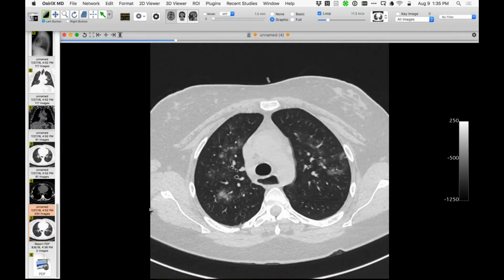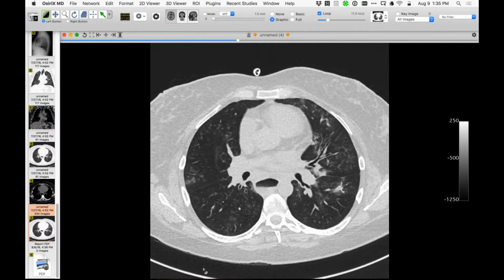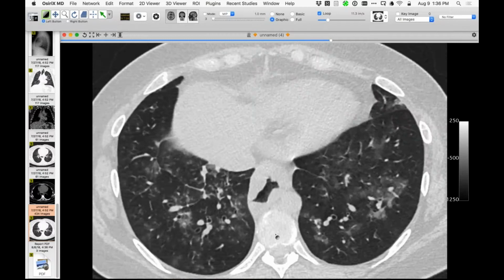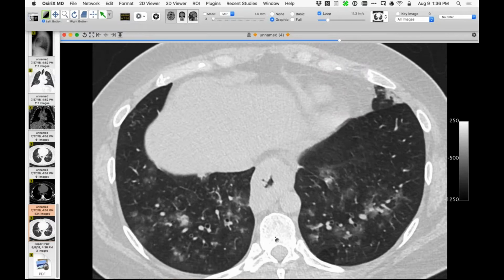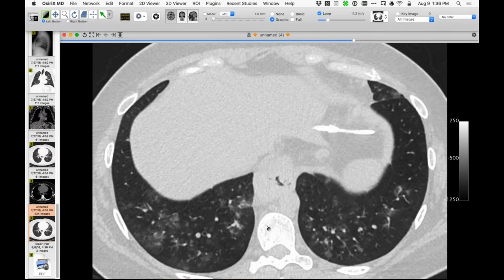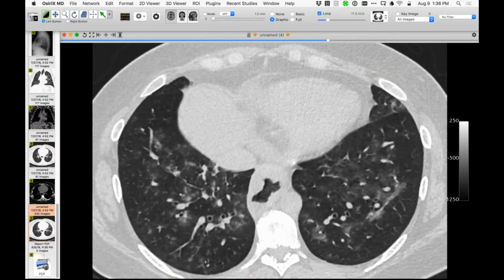And just look at the extent of abnormality in the lungs from top to bottom. Multiple opacities, consolidated ground glass, about bronchovascular bundles for sure. And then just for those trainees that are there, I'm going to quickly show you a couple examples of some really nice bronchiolar opacities or tree in bud, so that there's airway abnormality down here in the right lower lobe. In areas like this, for example, here's a little bronchiolar opacity there, and here's another one there. So I read this out as bronchopulmonary aspiration for sure.